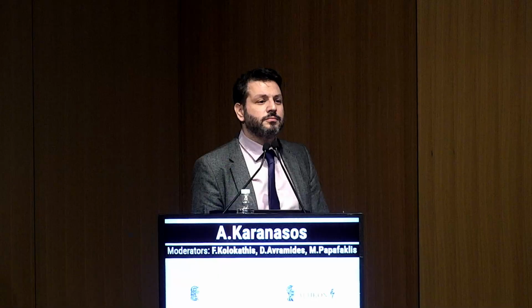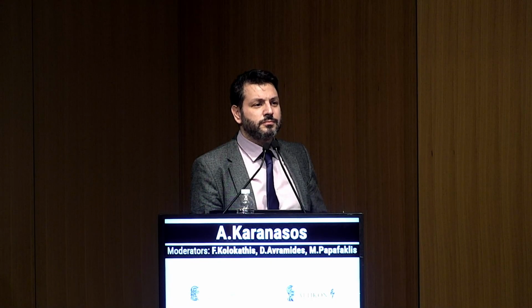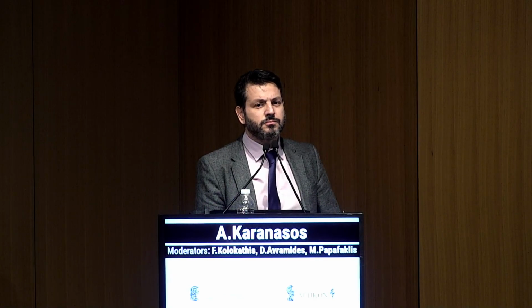Thank you for your excellent presentation, Dr. Karanasos. One quick question. We know that a limitation of OCT is that it doesn't work in big vessels, right? Do you personally have a cutoff limit, where you say, okay, the vessel is larger than 4.5, so I won't use it, I won't have good images? Do you have a personal cutoff point?